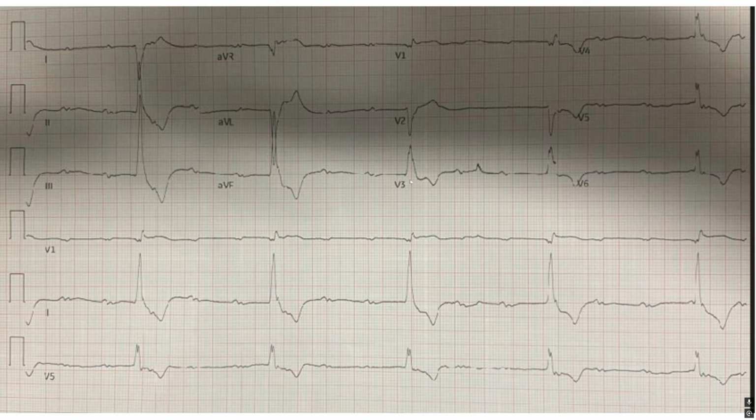So here's the EKG. Again, I recommend you pause and go through it, but this is wrought with pathology. Again, our scale is on point. Good. What are these guys all from Indiana? Because they have V1, lead 1, and V5 as our rhythm strips. What the F is that? But as we go through, what I'm seeing is a P, no QRS, so I already know it's not sinus. Here's my P wave. Let's march out my P to P interval. It is staying constant.